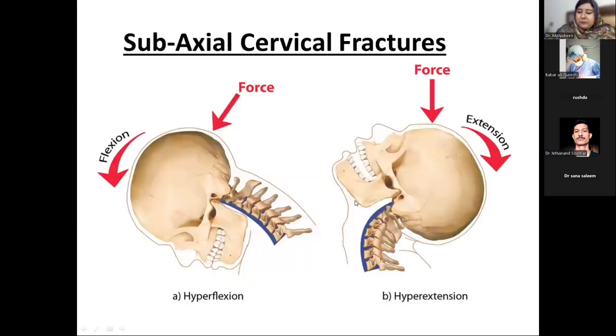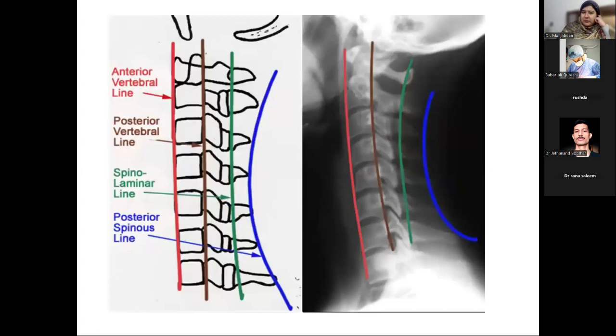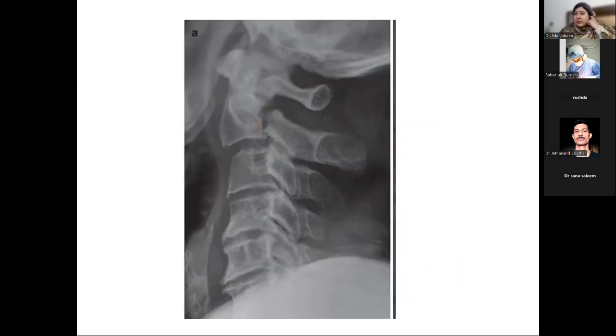Again, I think there was another picture, but I've somehow missed it. But this is not that common a fracture, but it's radiologically a very favorite question of many examiners, how to identify hangman fracture.